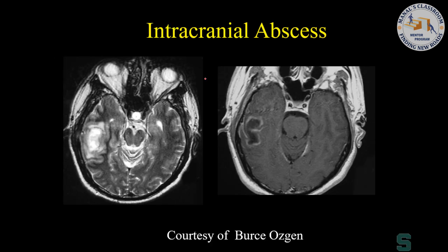And that final stage is that if it extends into the brain, as is seen here, this is resulting in a frank intracranial abscess. So what's the normal progression of disease? Unilateral effusion, coalescent mastoiditis, Bezold's abscess, dural sinus thrombosis, intracranial abscess. That's the pattern of disease. That's a normal progression of disease.